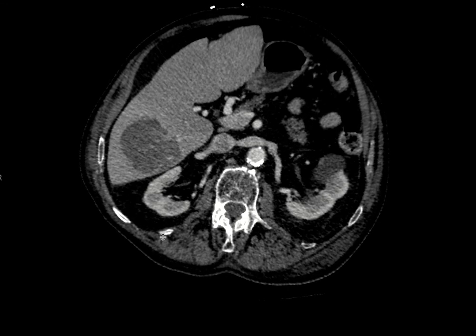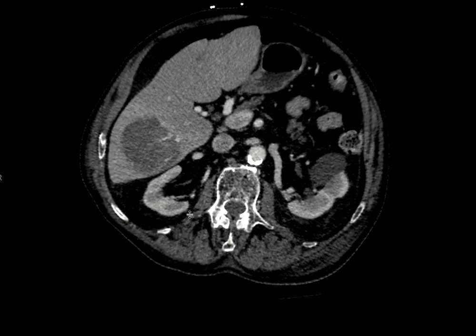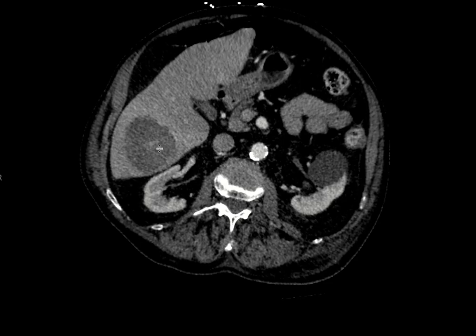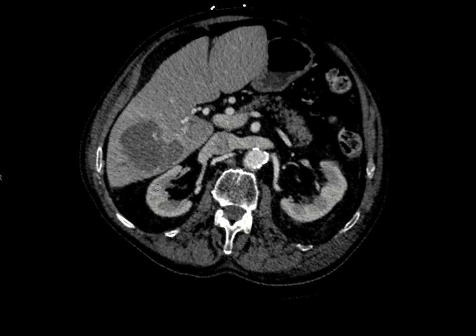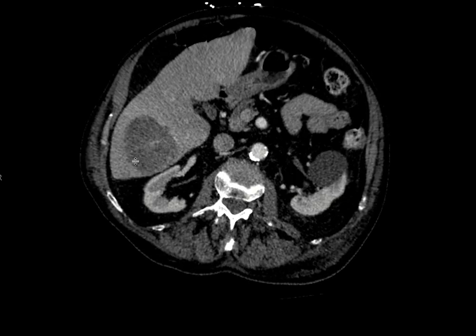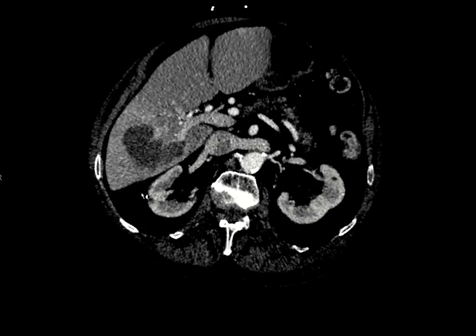You can see that this liver lesion measures around 6 to 6.5 centimeters, and it looks very low density. There are linear septations within it that we can see coursing through it. While metastatic disease is in the differential for this, given these linear septations, one also has to think about the possibility of an abscess.